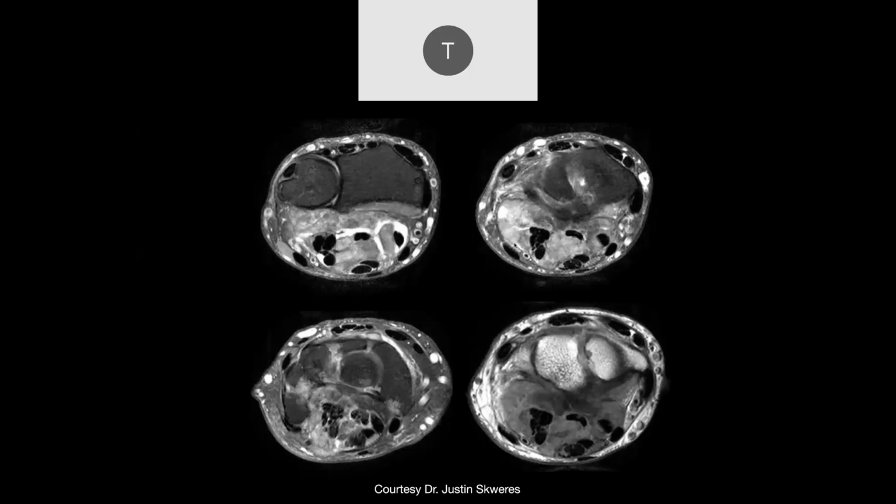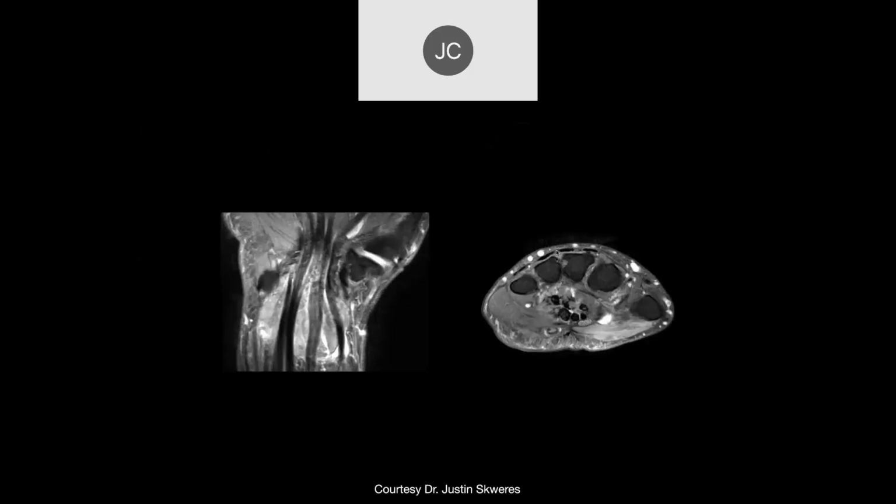I don't know, this literally looks like soft tissue to me. I think this is some sort of either infiltrative process or synovial hypertrophy involving the flexor tendons here. And with separation, it really looks like this may be a lot of synovial thickening coming down here among the flexor tendons. Any idea what this could be? Not sure. I guess it could be an atypical infection where you get a lot of this.